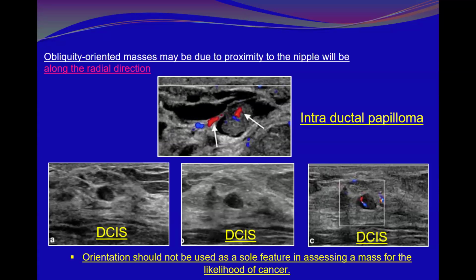Since I have a suspicious feature, I'm not going to search for reassuring features. Because we usually seek any malignant or suspicious feature to evaluate the breast mass and to exclude malignancy. If we have any suspicion, we go toward the suspicious features. We will not go toward the benign features.